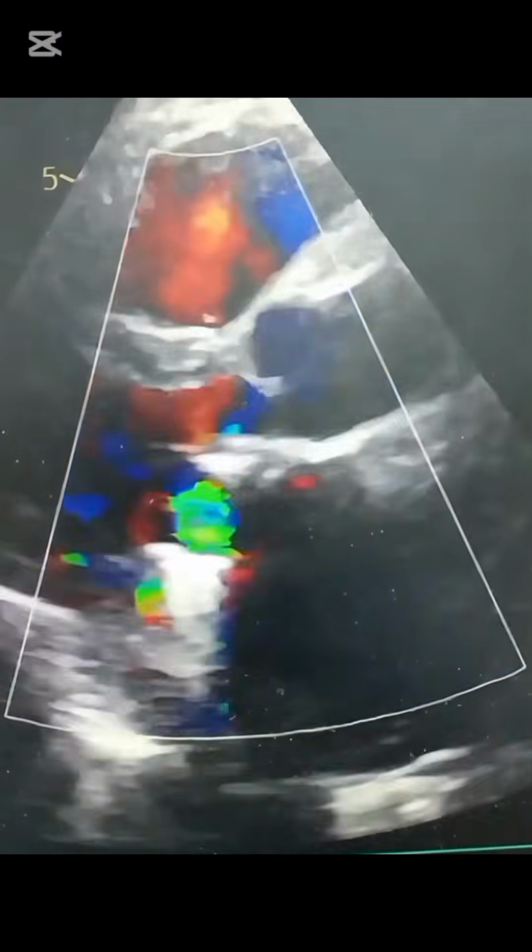Number four, pannus formation, the overgrowth of fibrous tissue around the valve, which can interfere with valve motion, similar to thrombosis but in an older prosthesis. Now, these above are the causes of a malfunctioning prosthesis.